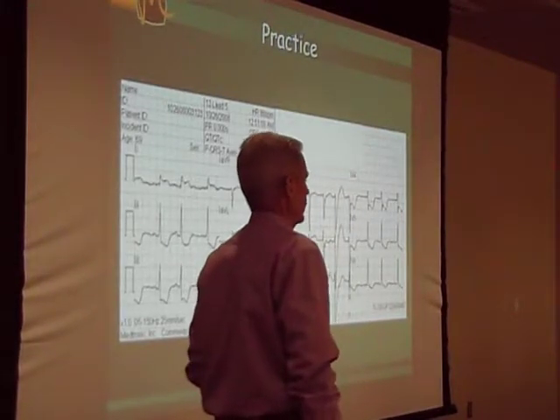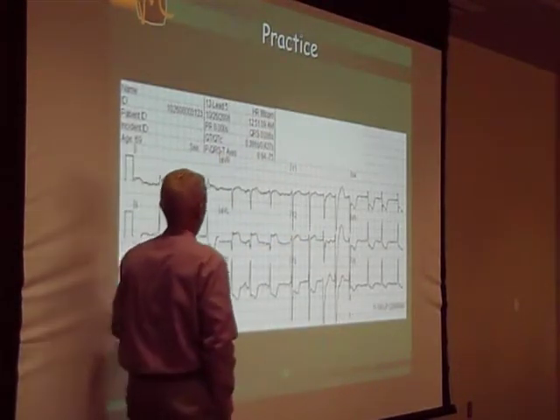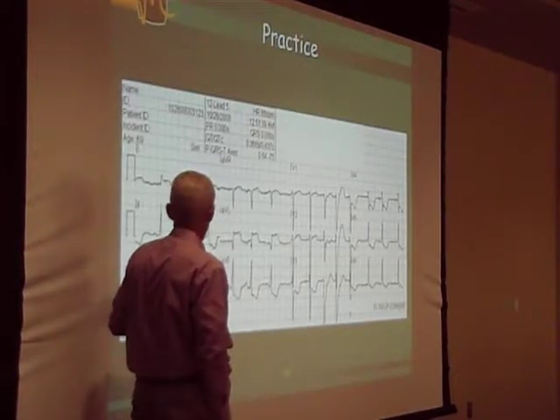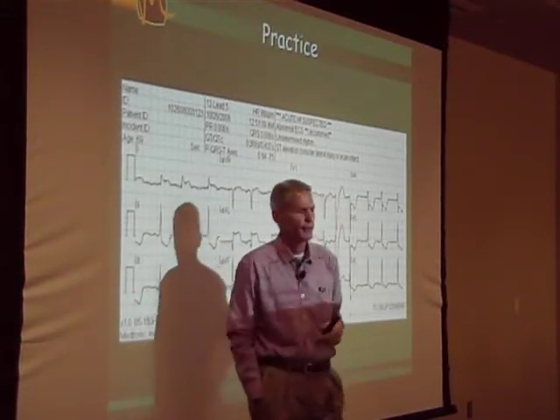And if I wanted to look for reciprocal change, where would I look for it? Right here. And that's exactly what you have. Looking at the algorithm at the top, consider lateral injury or acute infarct.